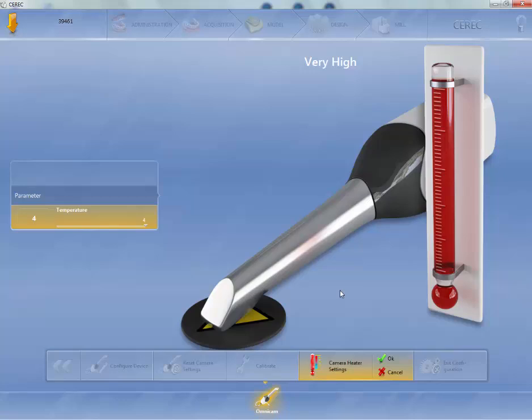It never gets hot enough to burn a patient. Matter of fact, they normally comment that it kind of feels very nice because most of our instruments are a little bit cold, and this one is nice and warm and it won't fog up. If you have this turned down too low, and if you spend more time scanning and not on the heater, what will happen? This will cool off and cause you to have issues with fogging. So start off with this being very high. Always remember that you have to hit the OK button.